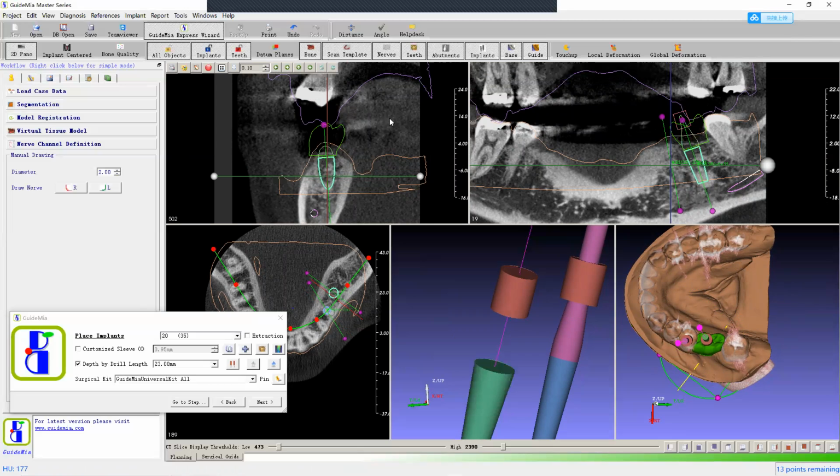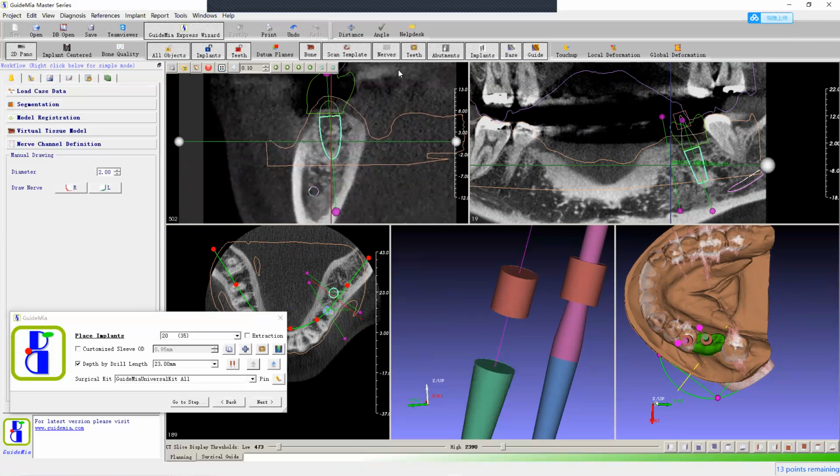The implant length is 11 millimeters, and the guided surgical kit typically has a 9 millimeter extension, or prolongation. Then you end up with 20 millimeters together, meaning from the apical point of the implant to the top, that's 20 millimeters.